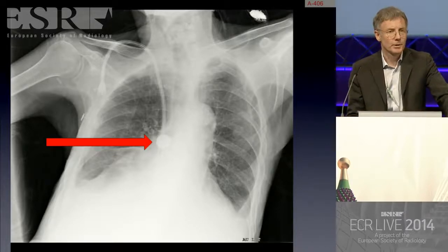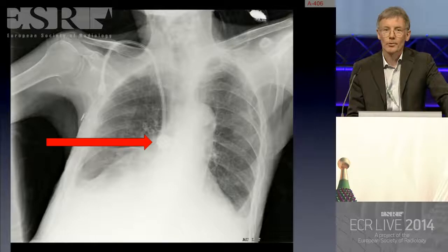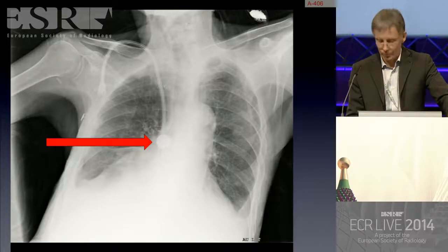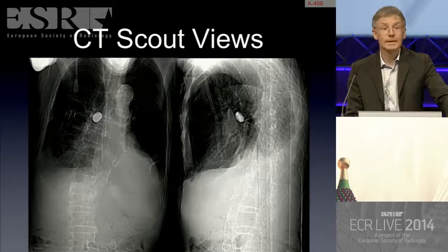The renal physician looking after this patient came to the department with the X-ray, asking the radiologist, what is this? It's on the 3 previous films, going back 3 months, and it hasn't been reported. What is this? So this is an example of a cognitive error, which means that an abnormality was seen, but not recognized, not reported. There was nothing on the patient's chest or his back, so a CT scan was performed. Remember, this was not mentioned for 3 months.